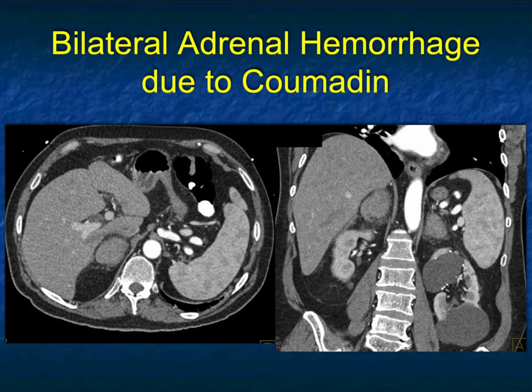Now, another case. Here you can see bilateral adrenal hemorrhage. This was also due to anticoagulant therapy, high density, oval, minimal stranding. You would go through a differential of what else this could be, anywhere from sepsis to DIC to metastasis. But again, Mets can bleed, but it would be exceedingly rare to have Mets bleed in both adrenal glands. I can't remember that at all.